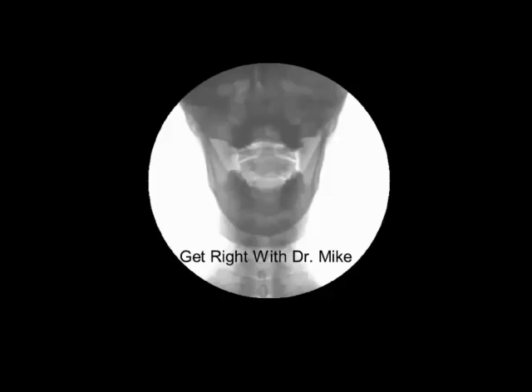Dr. Mike here. Today we're going to look at a case of cervicogenic vertigo. This patient developed vertigo after turning her head, her neck cracked, and her arm went numb, and the vertigo has been getting worse over the last couple of months.